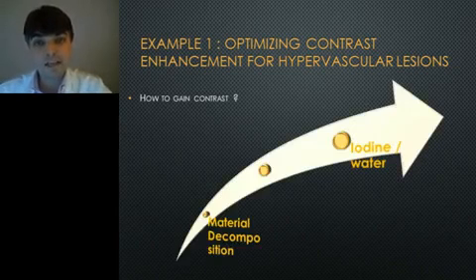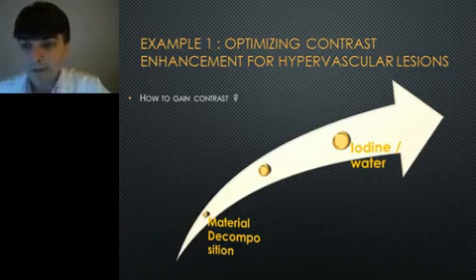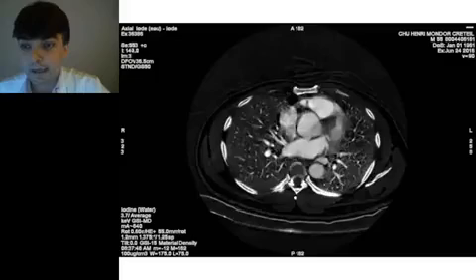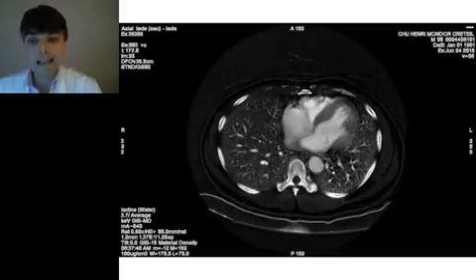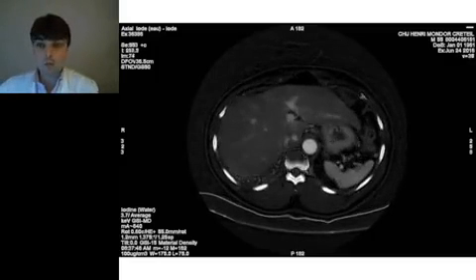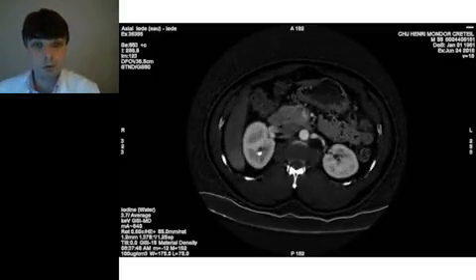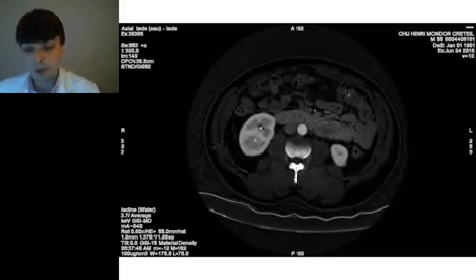So now we are shifting again the paradigm. We are no more looking at images which are Hounsfield unit maps. We're looking at images which actually show the relative concentration of iodine within the images that we can see. Again, the same patient, looking at a new way of seeing those images. Now you will see the contrast changes, and the way the images look, they change. And you can recognize that this is not what you're used to in clinical practice. These are not usual images.